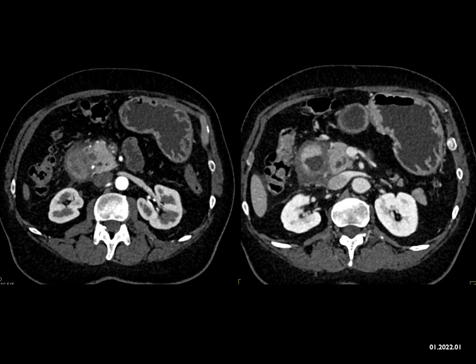Well, you could consider autoimmune pancreatitis anytime you see pancreatic enlargement, but that would not explain the duodenum. You can get dilated common duct or pancreatic duct with autoimmune pancreatitis, the whole IgG4 syndrome, but it really doesn't look like that here. Could this be adenocarcinoma?